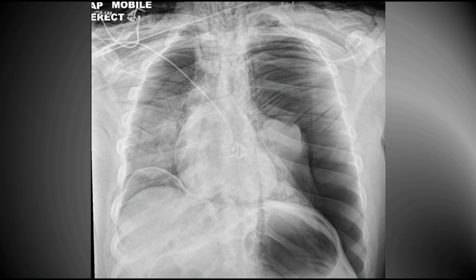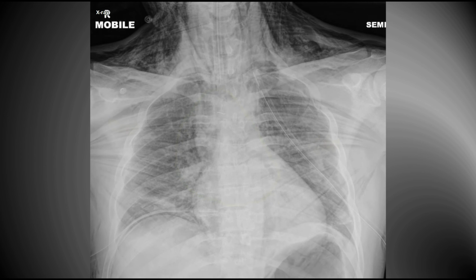Have a look at this picture. What do you see? Well, you'll notice there is really extensive subcutaneous emphysema all over the place, and there is a pneumothorax also on the left-hand side. The outline of the heart is really easy to see. It's like there's a lasso around it. So this is a patient who's had an esophageal perforation with pneumomediastinum and bilateral pneumothoraxes. The same patient is seen now with bilateral chest tubes in place. The lungs have inflated, but there is really extensive subcutaneous emphysema.